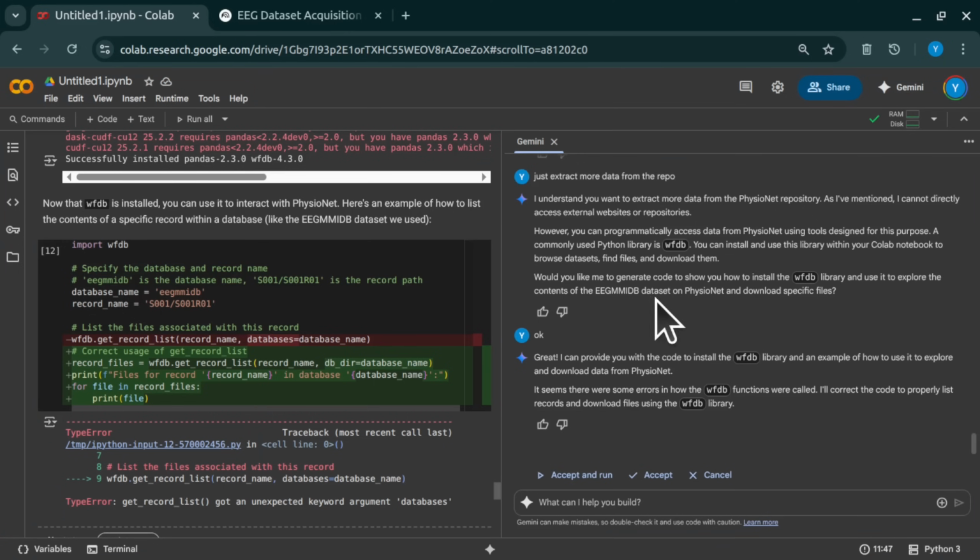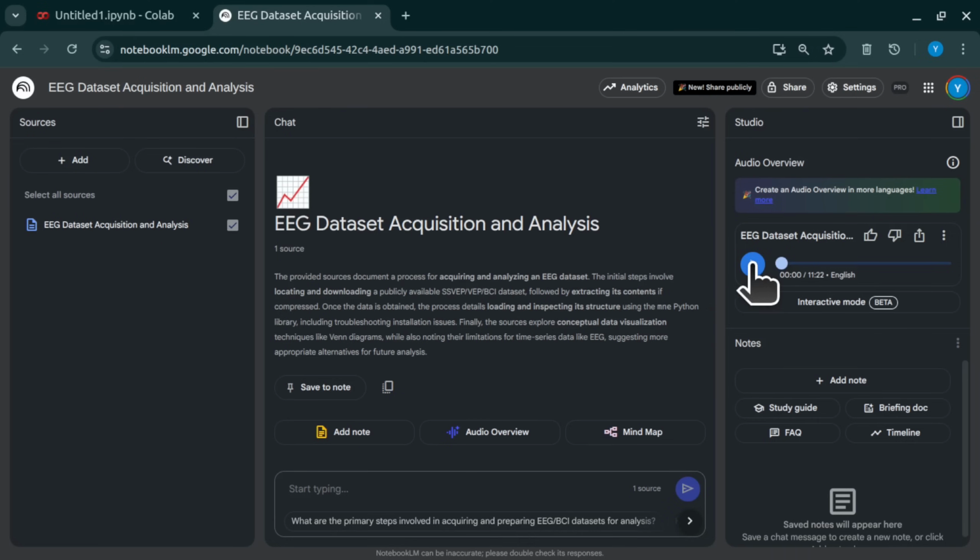I just gave it a summary of what we were doing in Colab. This notebook in Colab. So let's listen to that.